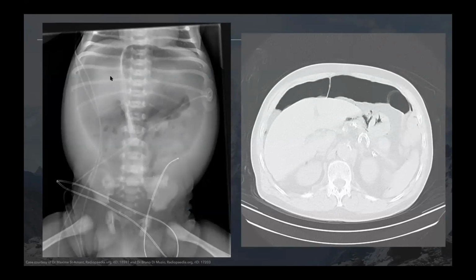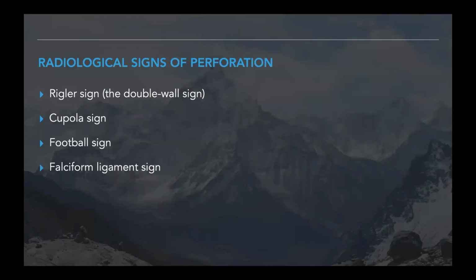So there is a density difference, whereas normally it's surrounded by normal fat and obliterated and you can't see it. Whereas because you now have air on either side of the falciform ligament, you can see it on a plain film. And you'll remember that the falciform ligament connects the liver, which is here, to the anterior abdominal wall. Okay? So those are probably the four main signs.